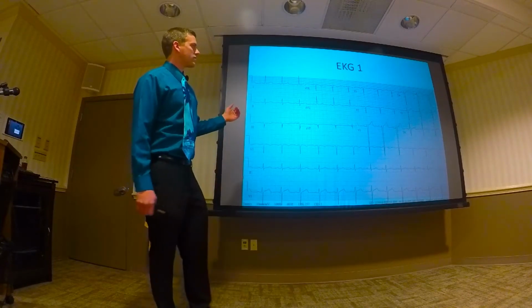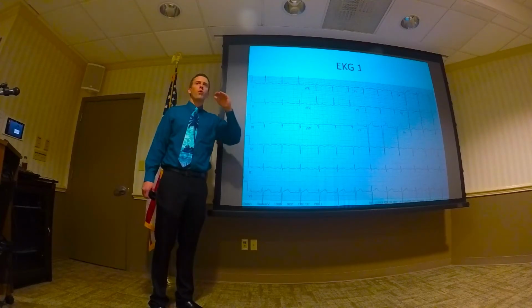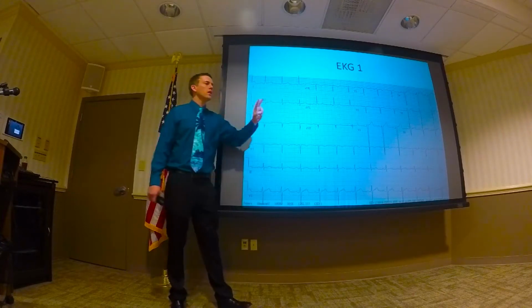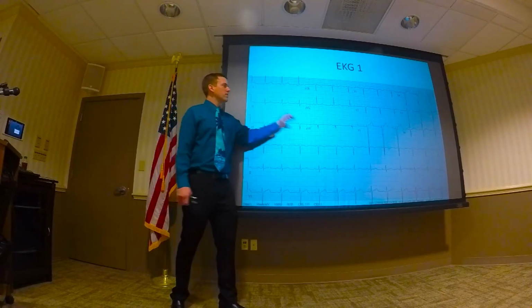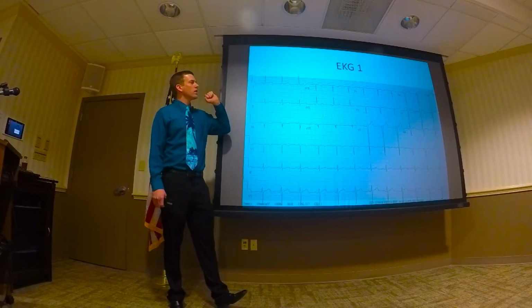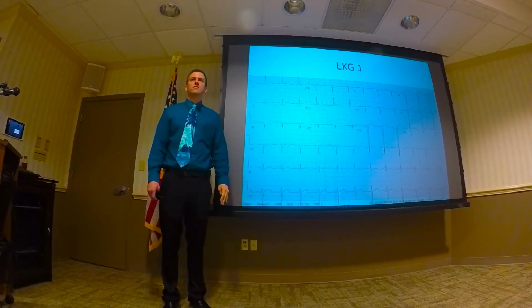I guess what I want to ask you with this is, can anybody tell me what the pulse rate is? And we'll do polling. Is the pulse rate 200? Is the pulse rate 75? Is the pulse rate 30? Or you can't be sure? 75. Anybody else?